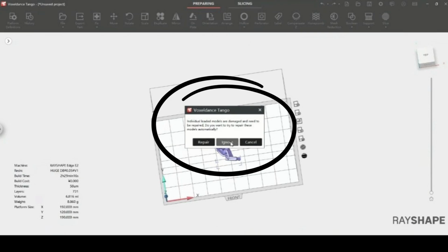For this one, it's giving me a warning asking whether I want to repair it or ignore it. So you don't have to. I've seen few occasions in which you have to repair it, maybe because the mesh was broken when the STL file got generated, and it had a hole, a tunnel, what is called a mesh tunnel, or a broken mesh, in other words.